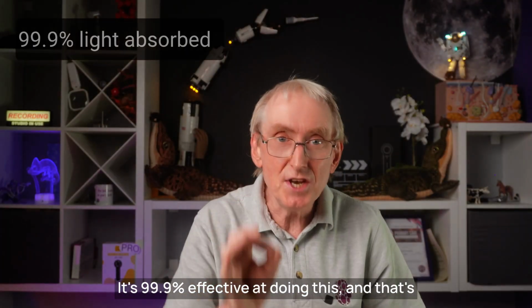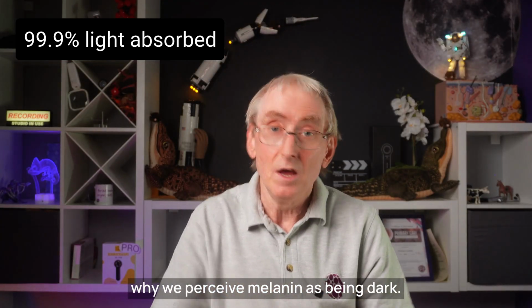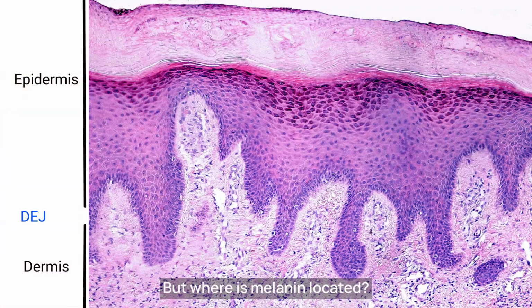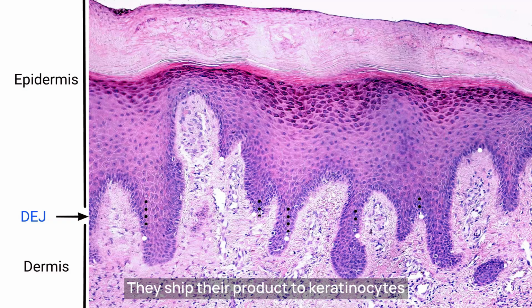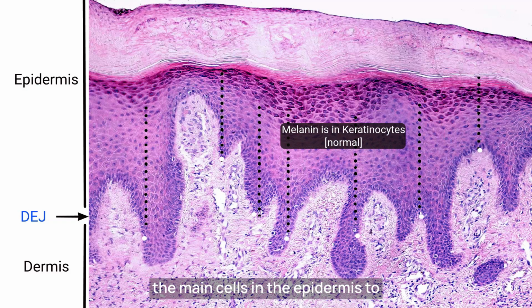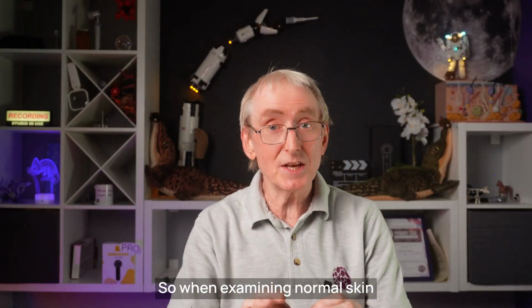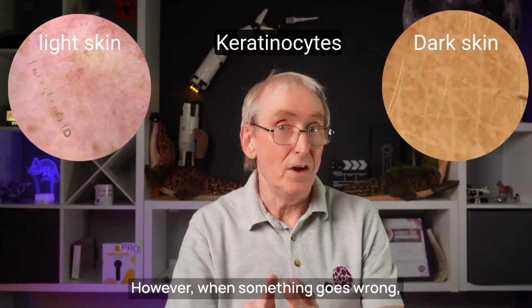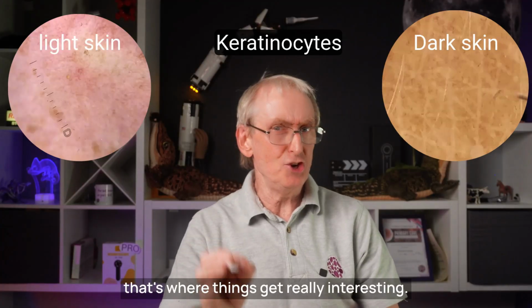It's 99.9% effective at doing this, and that's why we perceive melanin as being dark. The more melanin you have, the darker it appears in the skin. But where is melanin located? It's not in the melanocytes themselves. They are the factories. They ship their product to keratinocytes, the main cells in the epidermis, to protect their DNA in the nuclei. So when examining normal skin with a dermoscope, you'll actually find melanin in the keratinocytes. However, when something goes wrong, melanin can end up in the wrong place, and that's where things get really interesting.